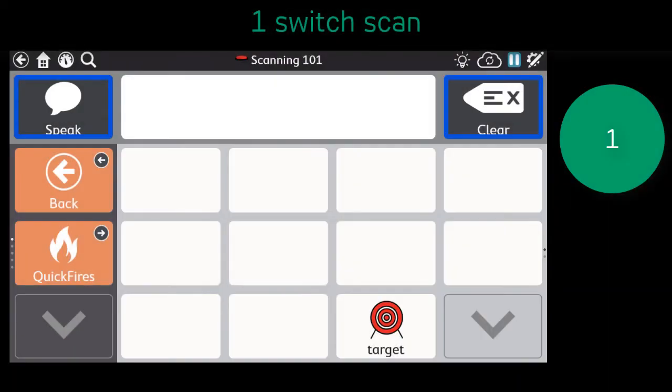In this video, you will see a single switch to the right, but as we watch this scan type in action, notice the length of time the switch is activated when the user is progressing the scan versus making a selection.